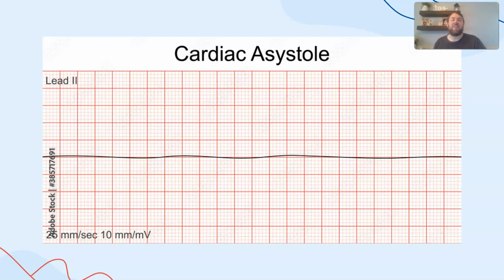Finally, this would be a cardiac asystole, A meaning not or none. And this would be no heartbeat, nothing going on with it. This would be the classic medical drama of beep happening with no heartbeat at all. This is very easy to see, so this will not be on the test, I can promise that.